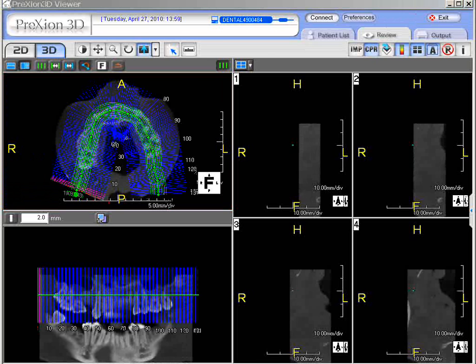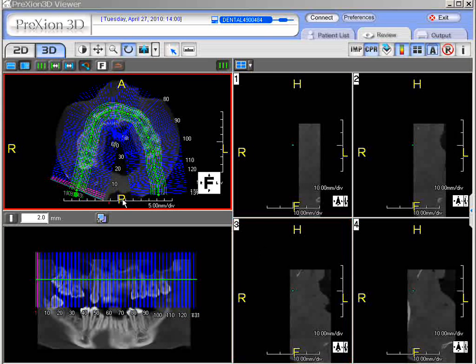All right. So here what we have is a representation. Here in the images, we're going to have a panoramic image that's drawn out with its subsequent distance, actually its thickness measurement icon here, and of course we get cross-sectional screens in the matrix on the right side. The pink lines, both in the axial screen and in the panel screen, represent the number of frames in the matrix on the right side.